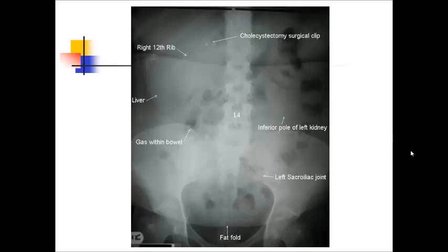The rest, parenchymatous organs as liver, pancreas: shadow of liver may be distinct, but not very clearly. Pancreas is completely invisible. Inferior pole of left kidney also can be found, but you will not be sure that it's not a mistake.